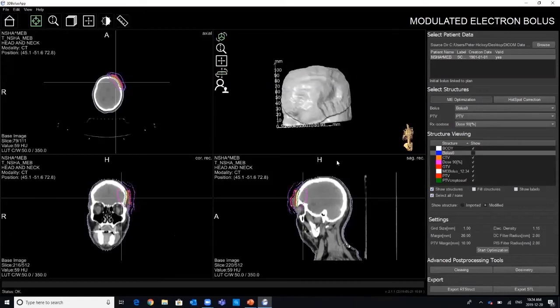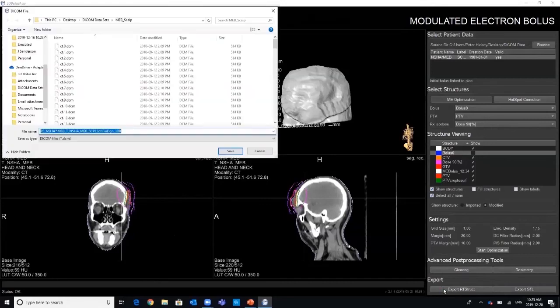Additional post-processing tools are available, such as cropping, cleaving, patient ID labeling, or adding dosimeter pockets that can be printed directly into the bolus. Once completed, users can export the RT structure and bring the plan back into the TPS for verification. This allows users to link the bolus to the plan so they can confirm they are satisfied with it prior to 3D printing.